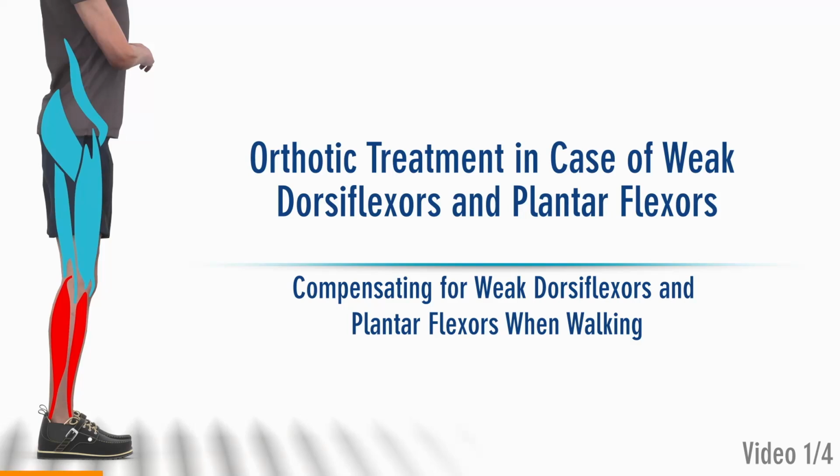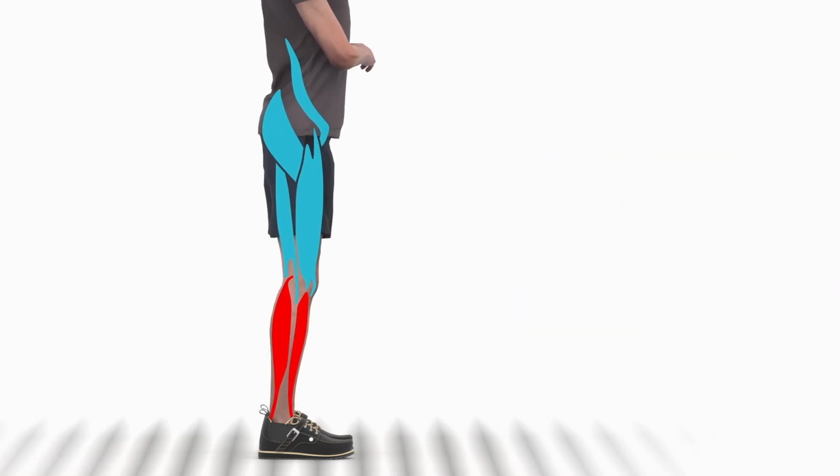Orthotic treatment in case of weak dorsiflexors and plantar flexors. Compensating for weak dorsiflexors and plantar flexors when walking. This is the first video in a 4-part series of educational videos. It is advisable to watch all 4 videos in order to fully understand the context.